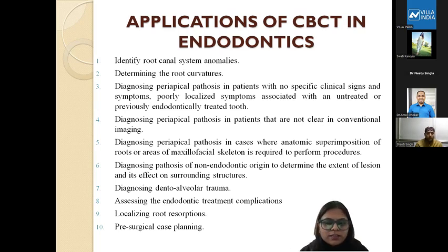We had seen a few cases. Because of a little lag of time, I won't be able to show all the cases and how we trace them in the software. Then assessing endodontic treatment complications and localizing root resorption. We have seen a few cases of root resorption here as well, and any pre-surgical case planning.